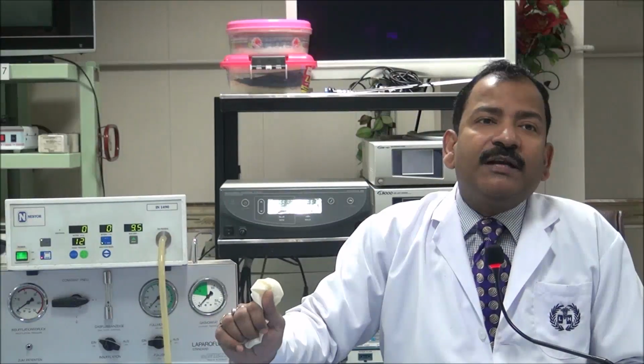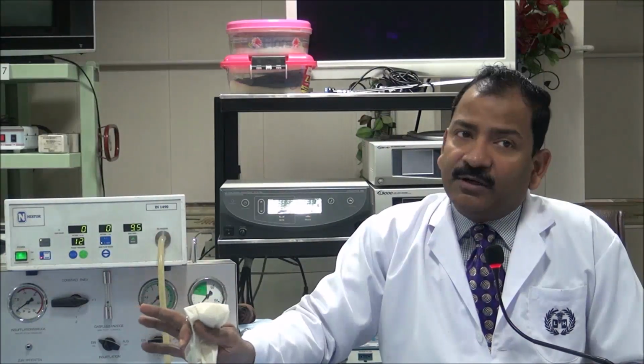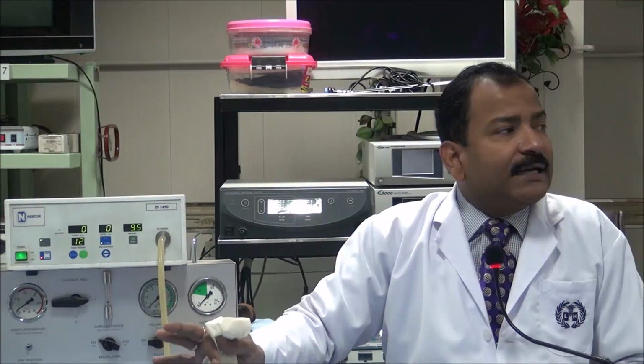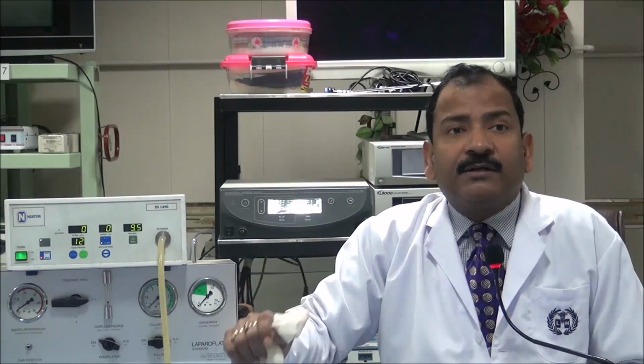No. It will not lead to air embolism. Remember, as long as your flow rate is 1 liter per minute, even if you put 100 liters of gas in our body, there will be no air embolism, because our body has a capacity. Do you know, during extensive sexual activities and marathon exercises, our body itself produces 200 ml CO2 per minute?